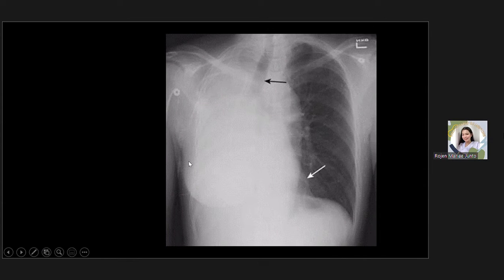Okay, good evening. Can you please describe what's wrong in this X-ray image? Let's start with the density. What's the abnormal density here? Is it opacity or lucency? There's opacity in the right lung. Correct. Basically the entire right lung is opaque. What else do you see?